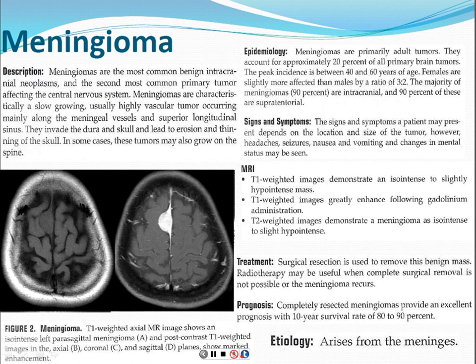This is the meningioma that I mentioned earlier. It can occur at that same angle, the cerebellopontine angle, where the cerebellum meets the pons, and can sometimes cause confusion with the acoustic neuroma. This is a really common tumor. You see these a lot.